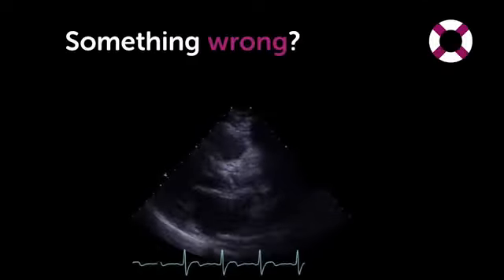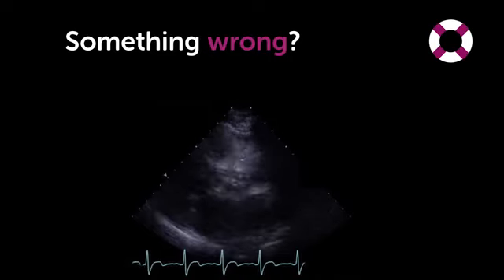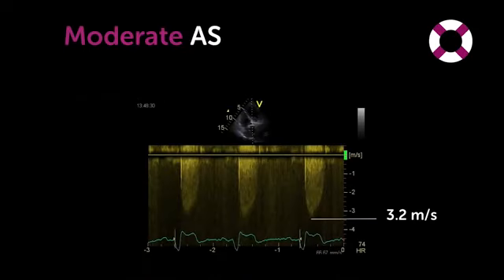Oh yeah, there's one more thing. Remember I showed you this aortic valve and I asked, is there something wrong with it? I'm sure you all recognized. It is calcified, thickened, and the patient has moderate aortic stenosis.